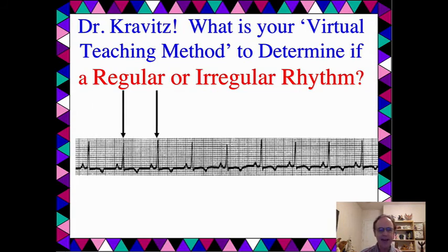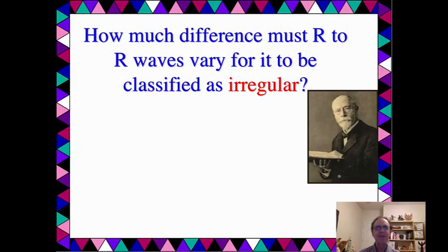So here we see absolutely no distance. Here we see now between the third and fourth, and you go from one to the next. Now from the fourth to the fifth, and now to the next. Yeah, you just work down the rhythm, and you're seeing if there is any difference, and it's time that we're measuring, if there's any difference in time. And we're not seeing anything, class. Look at that. That is a regular rhythm. That is regular.